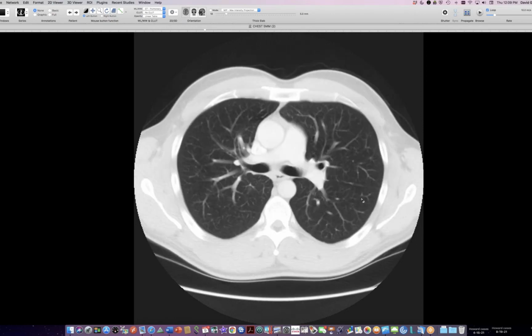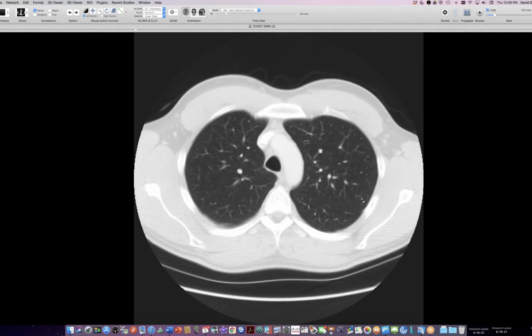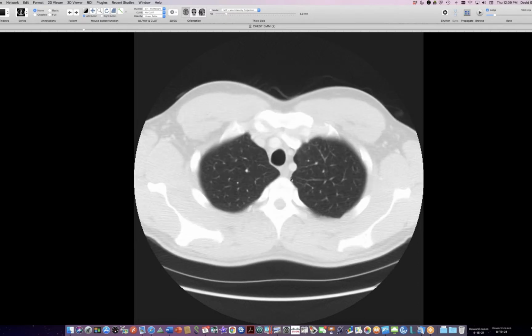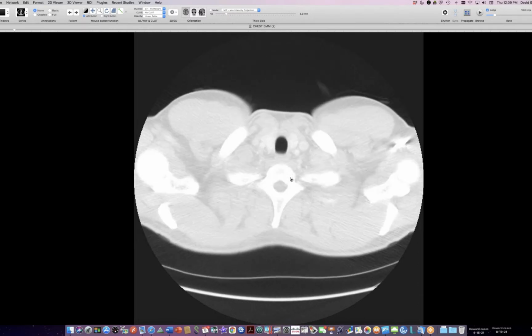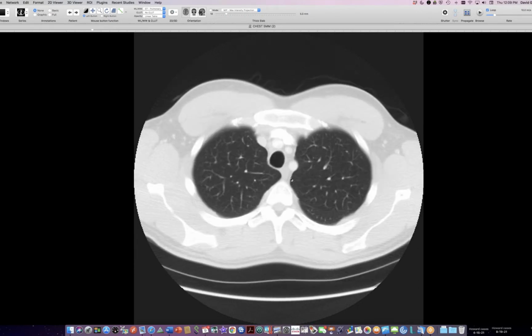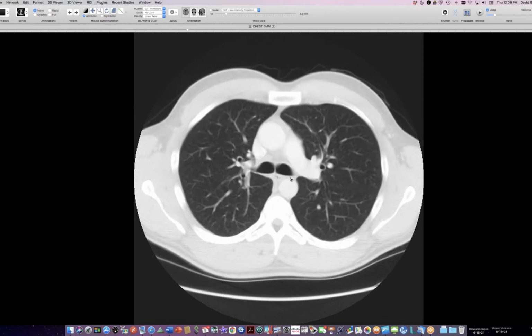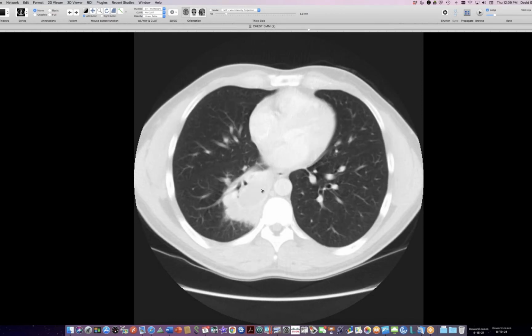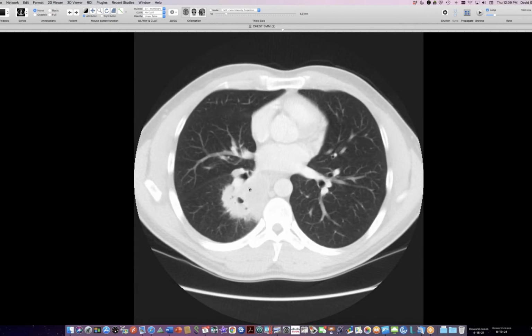Now his central airways look pretty good. He doesn't have that usual rough internal surface or polypoid stuff in the chest CT parts of the trachea, but higher up near his larynx, he does have lesions that have been treated many times in the past. So this squamous cancer here is probably degeneration of one of these wart virus tumors into a more malignant form.